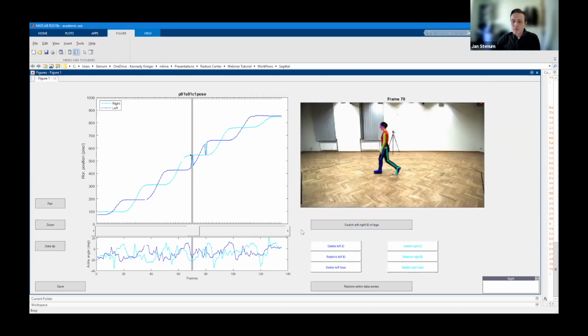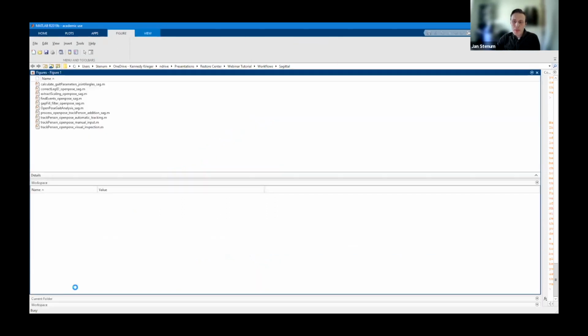These two frames have been switched as well. I'm going to go ahead and correct these. And then the last one is this frame that also has been switched. Now we can see we don't have these switched IDs, and the curve looks smoother. When we are finished here, we can go ahead and click Save.